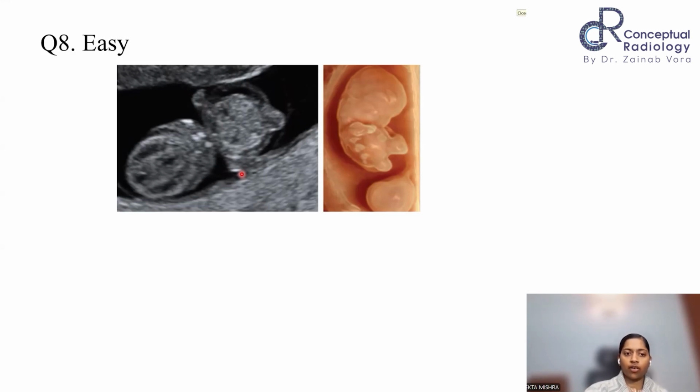Size, we see. We are not seeing the bud only. The lower limb bud is not there. Upper limb buds are present, but the lower limb is not there. It happens that both lower limb buds might have fused, and that's why they are not seen as distinct entities.